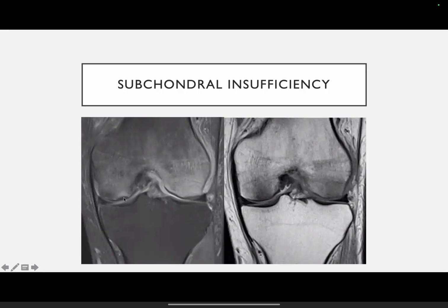So this hypointense, or dark, linear area which we see corresponds to a subchondral hypointense fracture, or a subchondral insufficiency fracture. The cartilage here looks more or less good. The body of the menisci is intact. And because of this edema, there is surrounding soft tissue edema deep to the iliotibial band. So this was a subchondral insufficiency fracture involving both the lateral and medial femoral condyles.